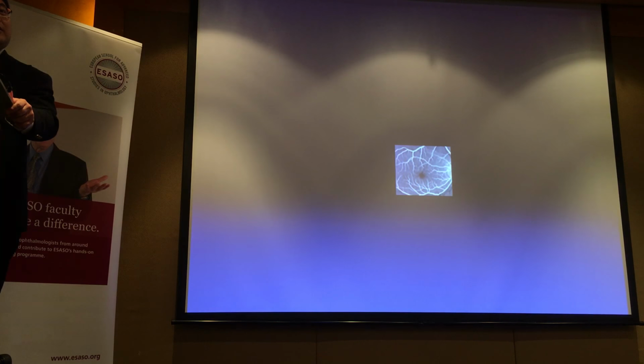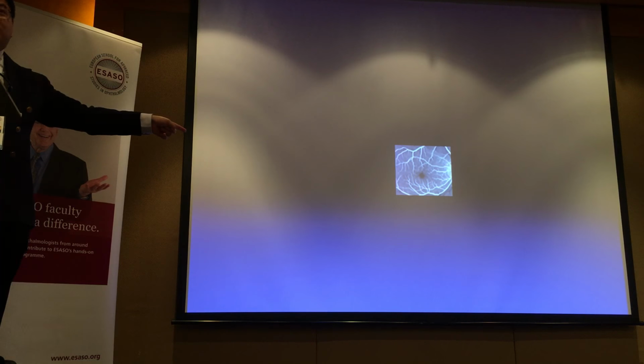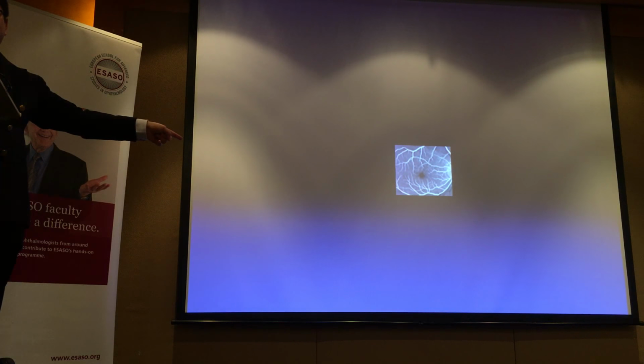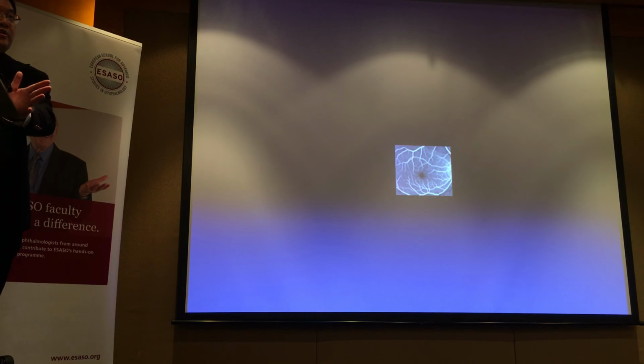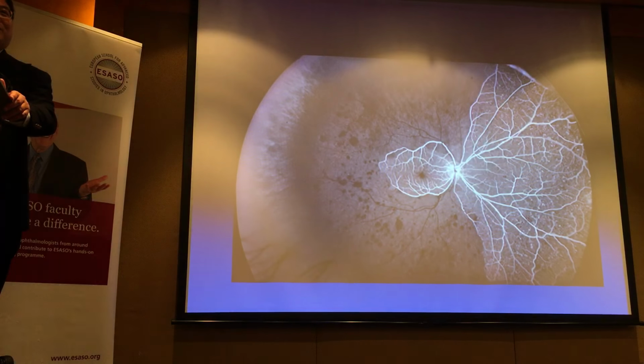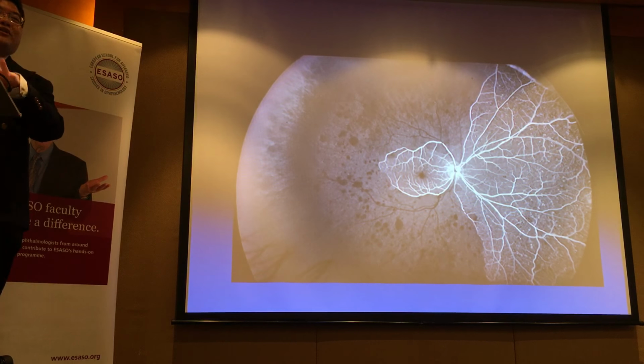But seriously, this though is a wide OCT scan, so at least a 30-degree scan, right? This is about what you're going to get. Maybe a bit more if you use a swept source, but the pathology could be elsewhere, isn't it? Okay, caveat: when I give the printout, I'll try to remove this photo because it's just lifted off the web, but I think it's a very illustrative point.